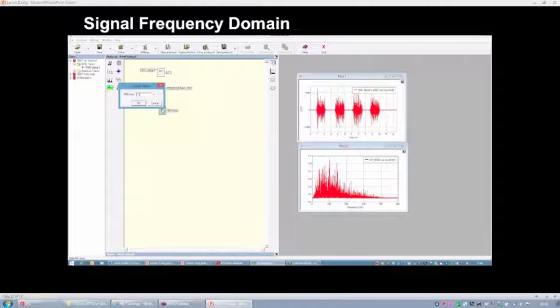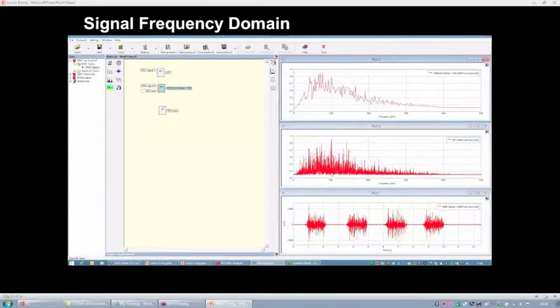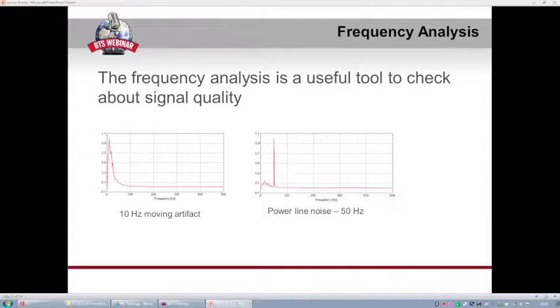So we will use 500 milliseconds. So the signal, and this is the result. Okay, so now you should have learned how you can compute the spectrum of the signal by means of our application.